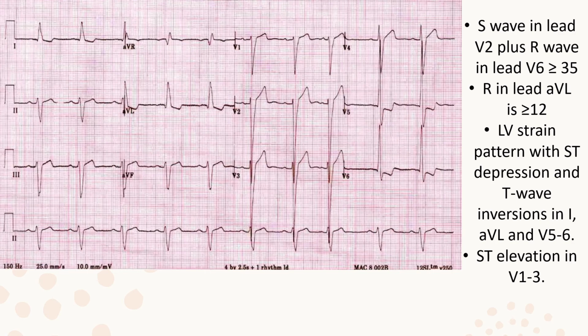Plus now the tallest in V6 or V5, and wow, I think V5 is tall. We got 5, 10, 15, 20, 25. It's halfway buried up into this other. That's another 30 at least. So 30, and I lost count. Where were we? I think we're like at 70. So that most definitely meets our criteria.